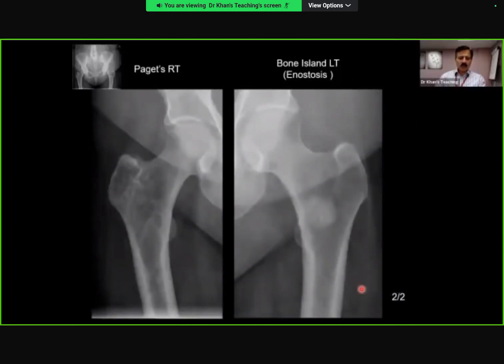Now, if you see here, first of all, the one on the right side is an incidental finding. And this is what can happen in the exam. There might be two findings on the same case. If you look carefully, look at these trabeculae. So this is early Paget's disease. This is thickened trabeculae and nothing more than that. So you got confused because of this and that is artifact, so don't worry about that.